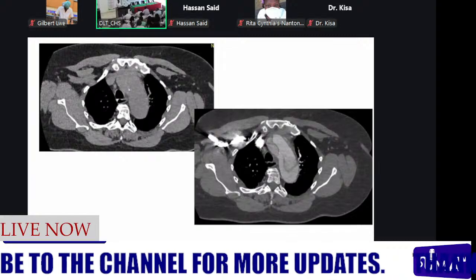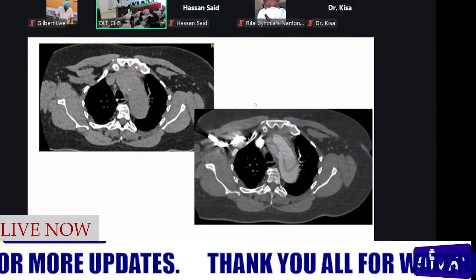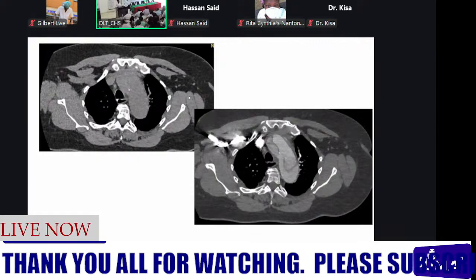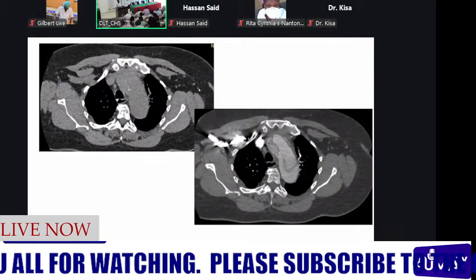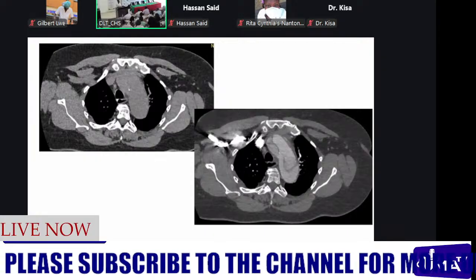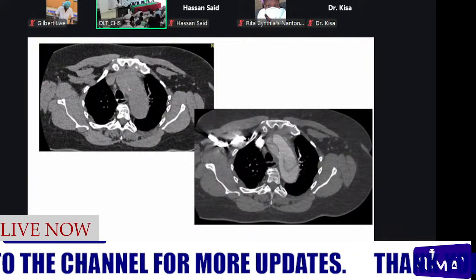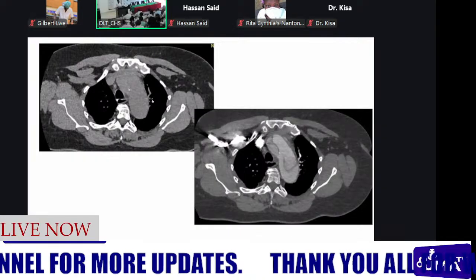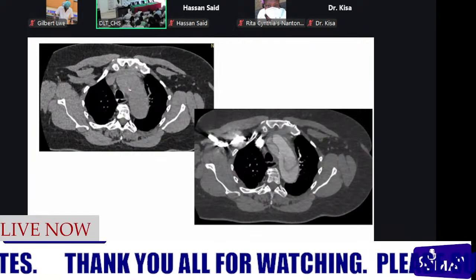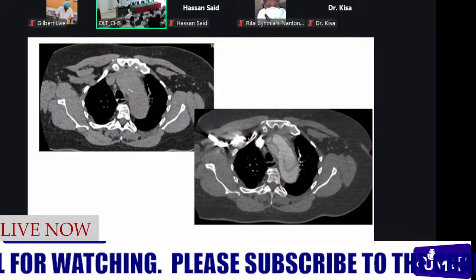So these are images of the patient. They did a CTPA, but regardless, we were able to pick up features of aortic dissection. These are 2 different axial slices. We have an uncontrasted on my left, then a contrasted on my right, and we are at the level of the aortic arch. For aortic dissection in an uncontrasted phase, we are interested in looking for any calcifications if they're present, because in cases of aortic dissection, the intimal calcifications will be displaced medially.